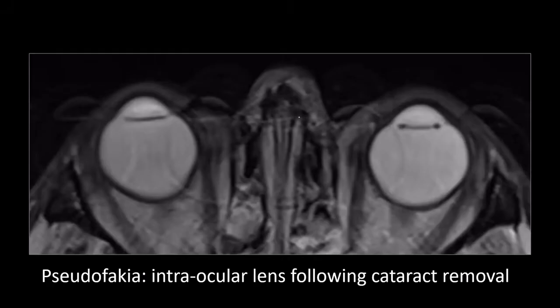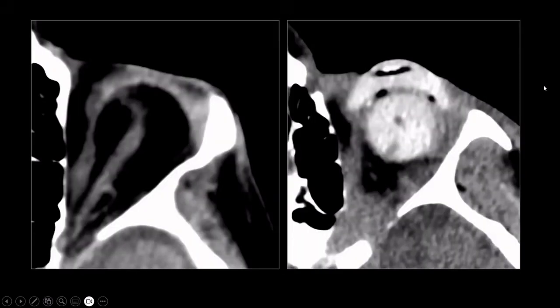Then let's talk about another frequent finding, pseudophakia or intraocular lens implants after cataract surgery. This is an MRI image, and while a normal lens is hypointense and biconvex on T2-weighted images, here we see these small plate-like structures, which are intraocular lens implants.